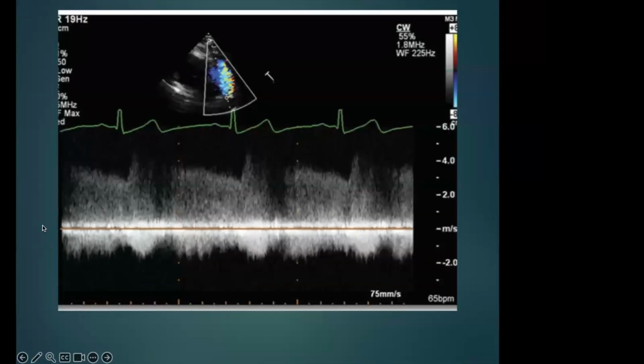There is the ductal view where you typically see PDAs, and essentially that's your aortic short axis, where you're going one rib space higher. That just allows better interrogation of the RVOT and start of the pulmonary artery, where you're going to be able to visualize this defect. Another view to see this is the suprasternal, where you will see an abnormal color flow.